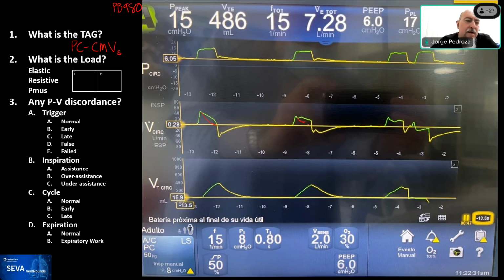Remember, this is a pressure controlled mode, so we should see the flow, and in flow we expect to see a decay, a triangle, very smooth, and as Eduardo has already drawn over it, we see a curve over it, which is PMUS. Certainly, we have PMUS, and in the expiratory phase, some say it's elastic, some say there's PMUS. Maybe Eduardo can put numbers on each curve.